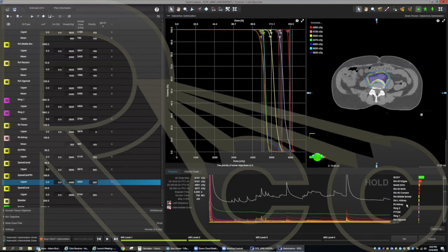Okay, this is close to leveling out. It's fine. I'll let it go. I want to just get to step 3 so that we can see this fine tuning.